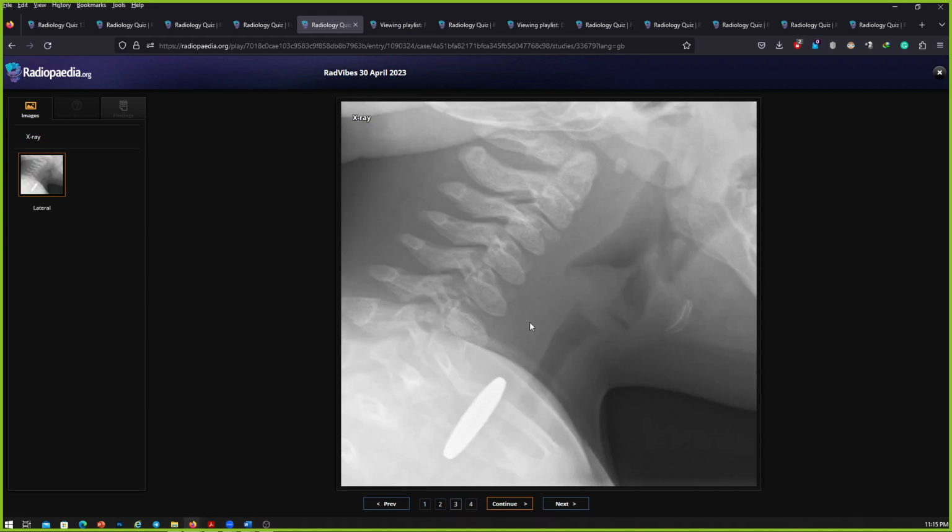Yes, the lateral radiograph is a cervical lateral radiograph of the cervical spine. It's showing the foreign body posterior to the trachea. So it confirms that it is within the esophagus, and it's rounded, likely to represent a coin entrapped within the esophagus. So this is an urgent finding. I'll correlate with the history of the patient and alert the referring physician about the presence of the foreign body. It likely needs urgent management because it will not go down, as it's entrapped within the esophagus.